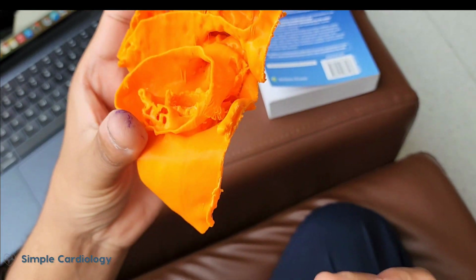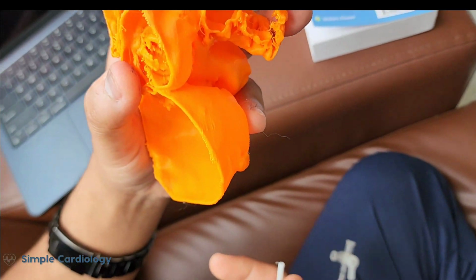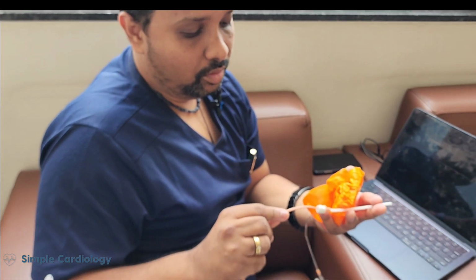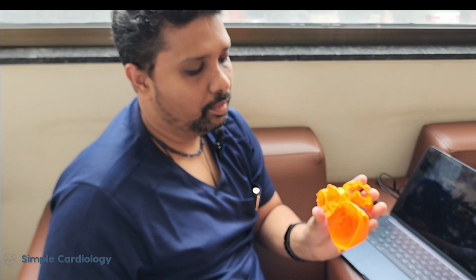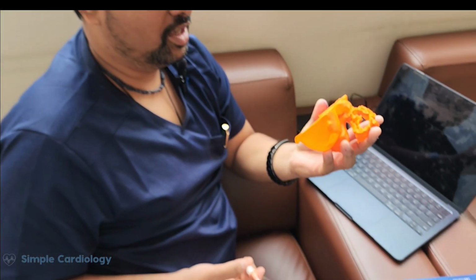In fact, if we have a balloon, we can size it outside the body. Many people have a problem with sizing inside the body with a paravalvular leak because it may dislodge the valve. It may increase the leak. So sizing it would be much easier outside the body with this kind of a 3D printable model. That's the whole point of this small session with you. Thank you.